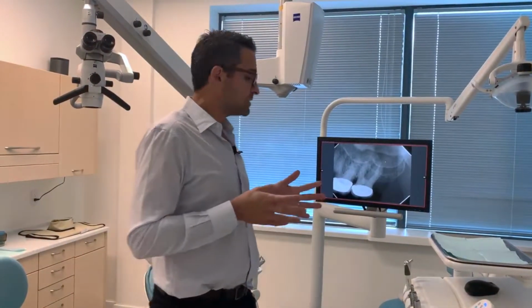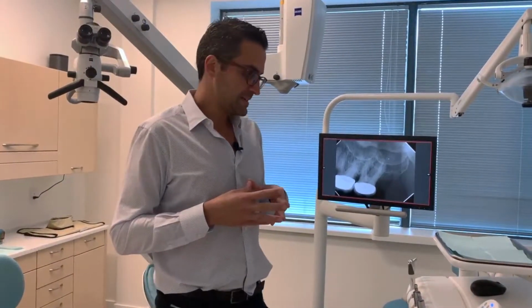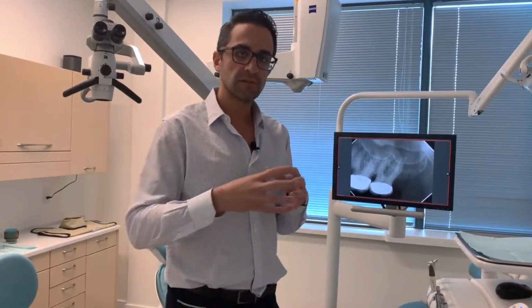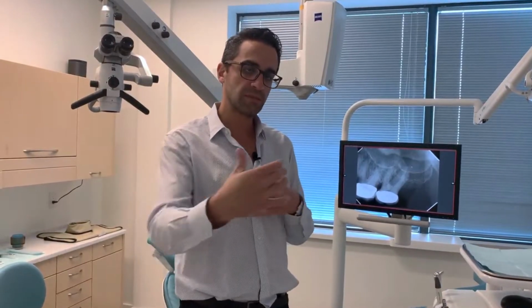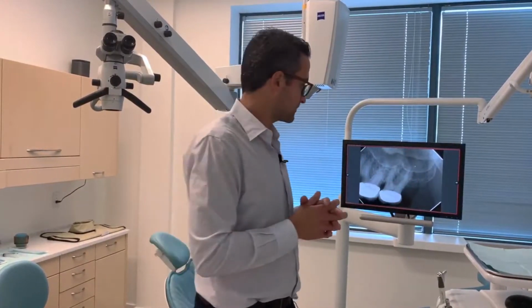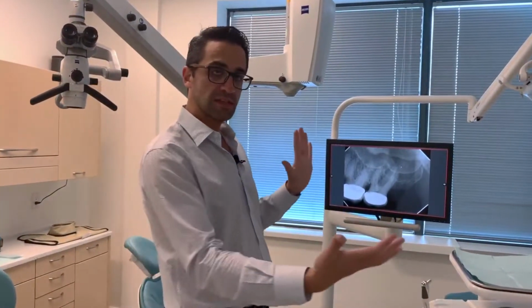So I suggested to the patient to take a CBCT, which is, as you might have seen in one of my previous videos, an imaging technique that lets us take three-dimensional images of the tooth so that we can inspect it in any angulation and see what is happening at the level of each tooth separately from the other teeth. On this x-ray here, everything is really superimposed. Everything is really stuck together.